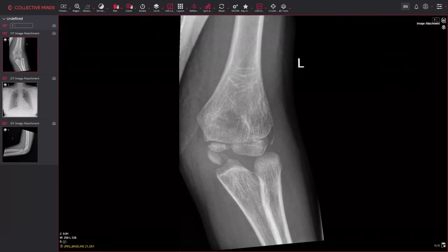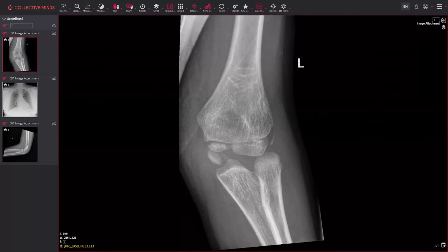The way we describe fracture displacement, we can describe it in terms of the plane in which it's moved, so proximally, distally, medially, laterally. Volar displacement or dorsal displacement if it's finger or wrist. So just have a look at some of the terminology there, depending on where it is in the body.